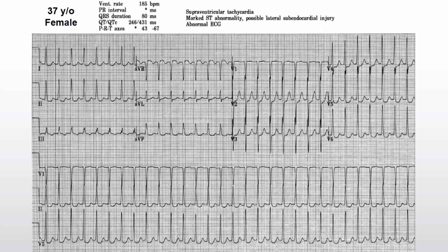For the PR interval, we see only an asterisk. This is because the machine is unable to locate anything that it recognizes as a P wave. It has the same issue when calculating the P-axis in the frontal plane.